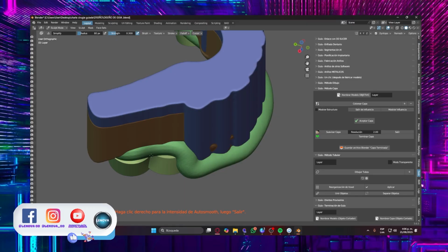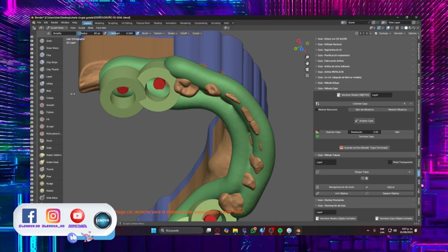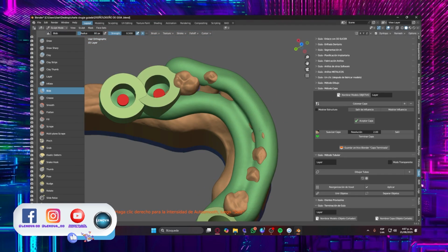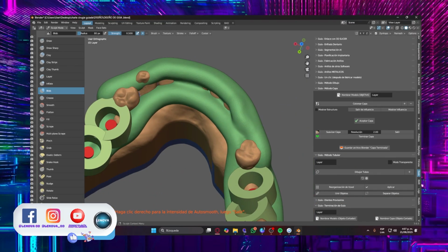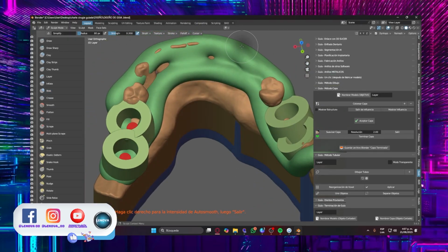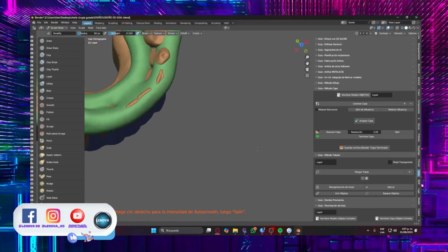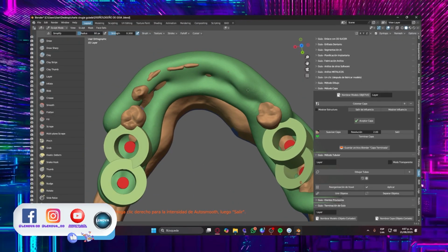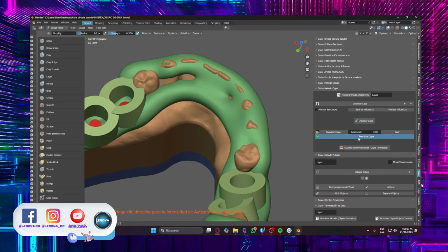Ready. Now press T and all the block brushes appear. That's it. I'm going to use loop. For what? To increase the fill, everything as this part directs. I leave the windows here in lingual. I keep smoothing down. So notice that the windows no longer have to be square, but they can be the same width of the incisal edge or maybe the occlusal edge, the present teeth, right? And their finish. And now the booleans start.